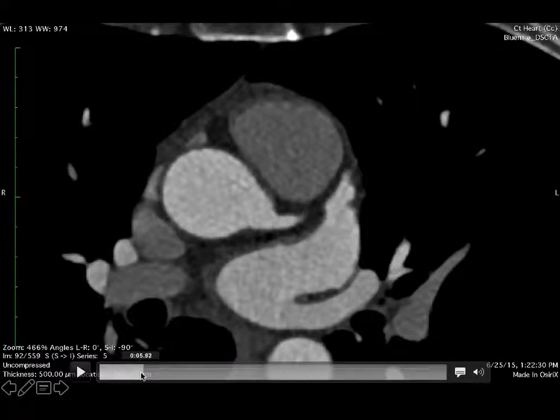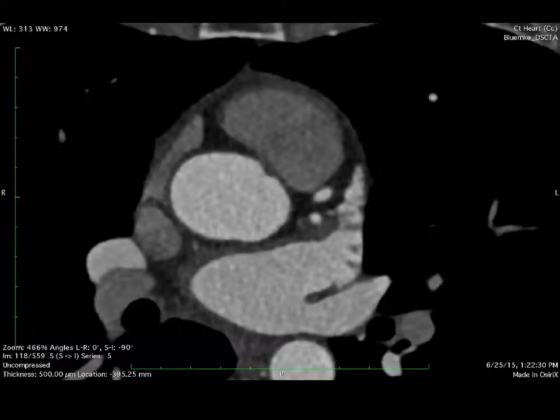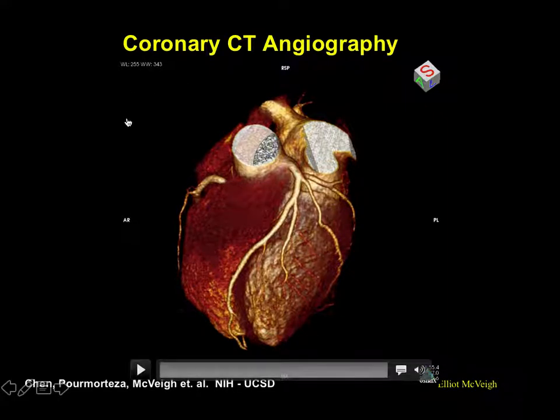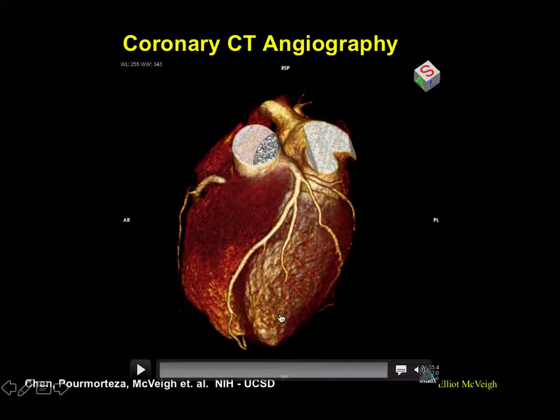Okay, and the blood in those coronary vessels, as you can see, is full of contrast, and so they have high contrast, which is why you can make this picture. All right, so when you go to segment out a tissue type and it's blood that has contrast in it, you can segment this out quite well from the underlying fat, the underlying myocardium. And then here's blood that's in the right ventricle that doesn't have a lot of dye in it, and so it doesn't show up terribly bright. The blood in the left ventricle does show up quite bright, but these vessels are separated away from the ventricular cavity.